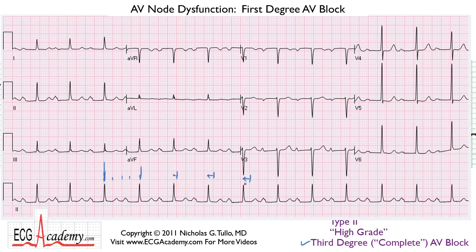So you can see there's a progressive movement of the QRS complexes away from this heavy line. First of all, since it moves away from the heavy line gradually over the course of several beats, it means that the beats are regular. And it also lets you measure the rate in your head a little bit more accurately, because you know it's not 75, it's a little bit faster than that. So we're talking 76 beats per minute.